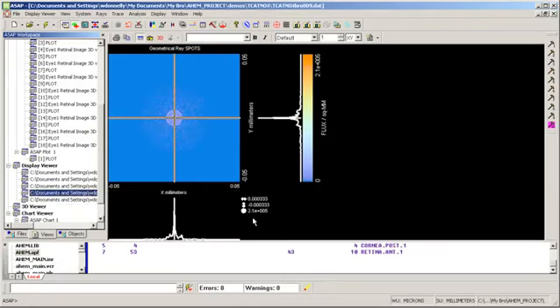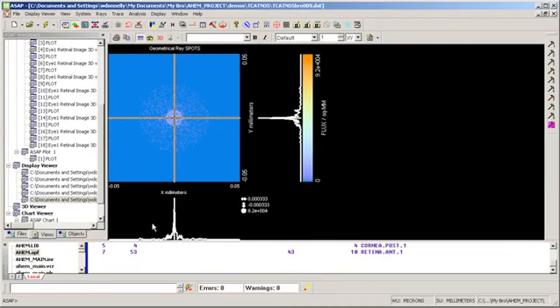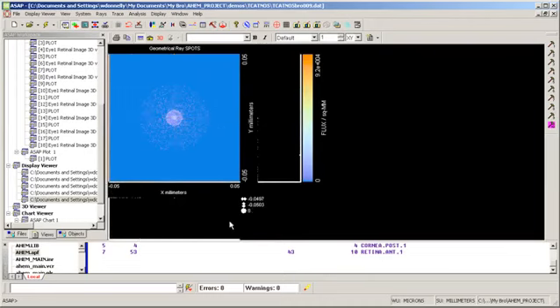And I keep going down, and there's a little more scatter out here in the periphery as well. It's gone down to 2.1, and even farther here, 9.2 e to the 4th instead of the 5th. And if I enhance this, I can see a little more of that scatter on the outside. So that's how light scatter behaves when you're keeping the particle size the same and increasing the concentration.